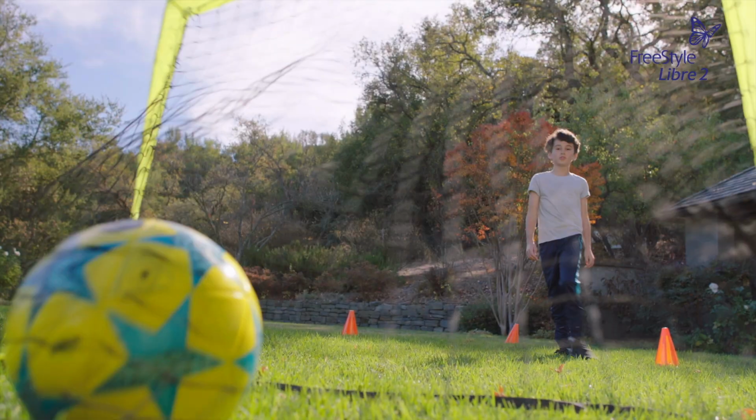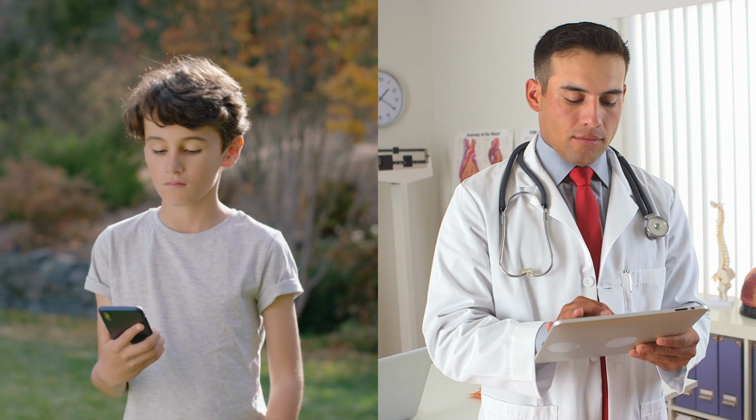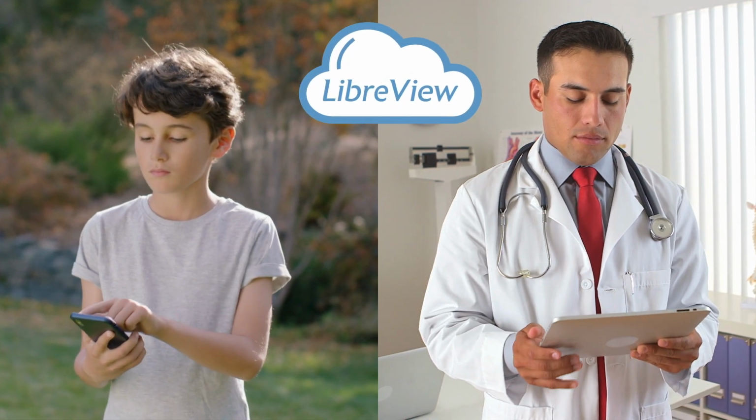It's great that Daniel can easily share his glucose information with his doctor right from his phone. And his doctor can view his glucose trends and patterns to help him manage his diabetes remotely.